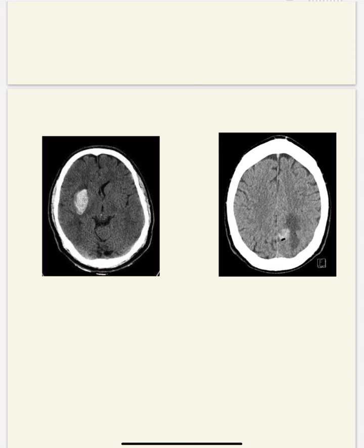But in primary hemorrhage, there is no breakdown of the blood-brain barrier, that's why there is no leakage. So this one may be a primary hemorrhage because of hypertension. Sorry, in this case it is a secondary hemorrhage. It is because of a mass. When we evaluated this case, he was found to have colon cancer with metastasis to the cerebrum.